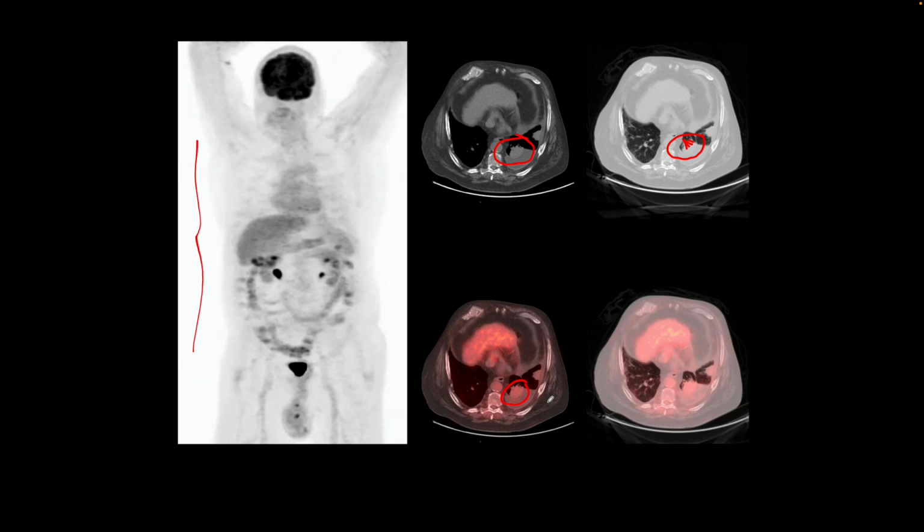So rounded atelectasis is a common, incidental finding associated with pleural disease such as pleural thickening, calcification, or pleural effusion, and it may persist for some time, giving an appearance of a tumor. And in that situation, instead of putting a needle in trying to figure out whether there is a tumor or not, we can easily do a FDG PET CT study to look for focal hypermetabolism.